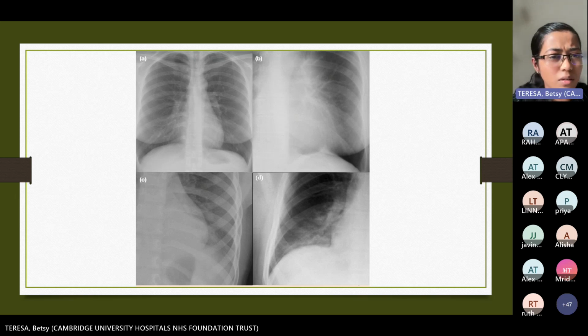Again, this is a diagram just to show you a few examples of X-rays. I would love to hear from you guys about what you think about each X-ray. Would somebody be able to tell me what the first one, what A shows? You could drop a message on the chat box. I just want to know how much you've understood after all I've explained to you.